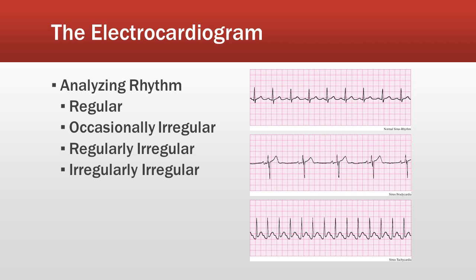Analyzing the rhythm. You're going to get some calipers out and analyze your R to R intervals. And if they fall at regular intervals, then the rhythm is regular.